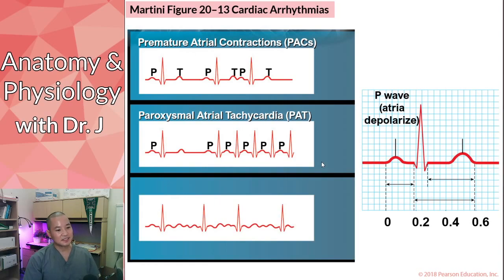Now, what we see here is a different type, and these are all actually cartoons. Most EKGs have much more noise than this, but I think starting out, they're trying to make it more accessible so that you're not getting thrown off by different patterns. Where's the P wave? Where's the T wave? We definitely see the QRS complexes. These are the very sharp spikes we see here. But everything in between is kind of muddled, right?